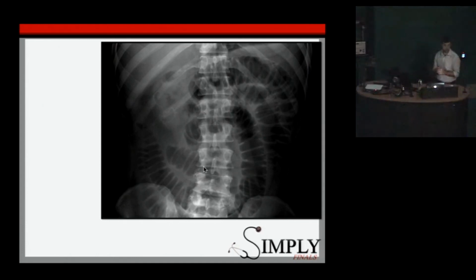Extended loops of bowel, centrally. So present it like so. Sorry, that's right. It doesn't have a name or a date or any of those things. Yeah, forgot to put them on. This is an abdominal X-ray with reasonable penetration, and the major abnormality is distended loops of small bowel centrally.